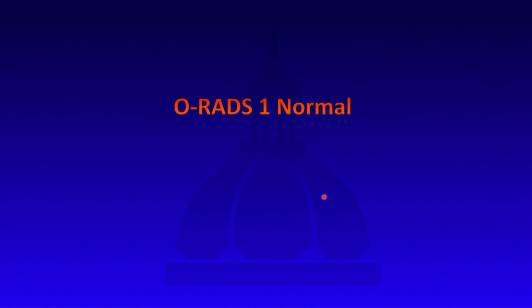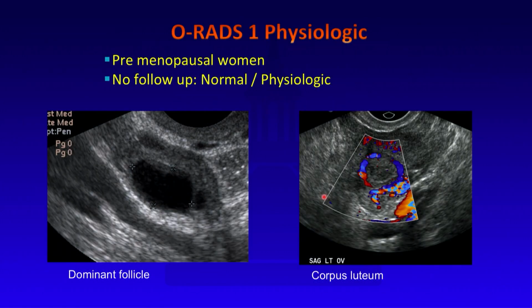O-RADS 1 is normal. So, for example, usually they are premenopausal women, and it could be a dominant follicle, or it can be a corpus luteum, and the telltale sign of corpus luteum is this ring-like peripheral vascularity. And I don't say O-RADS 1 in my report, I just say normal. Right? We don't want to confuse people.